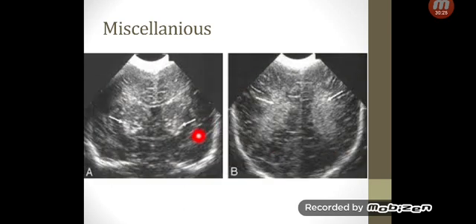This one is cool because I got this one from a personal experience with a patient from before. So you look at this scan, you're thinking there's nothing much happening. It might be just some light artifact or a flare or something, but actually it's all localized to the midbrain.